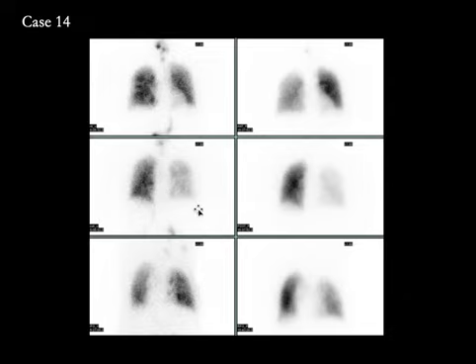Now, over a period of time, when there is acute PE and there is no blood going into a lung, body's compensatory mechanisms come into play, and there is a regulation of the airways in such a way that more ventilation is sent to the other well-perfused lung rather than the lung with deficient perfusion. So that is the reason why the ventilation is abnormal here. But since the perfusion abnormality is more severe, this patient had a saddle-shaped embolus sitting in the right pulmonary artery, causing diffusely reduced perfusion to the entire lung, and that's the reason we see this asymmetry between more severely reduced perfusion in the right lung compared to ventilation.